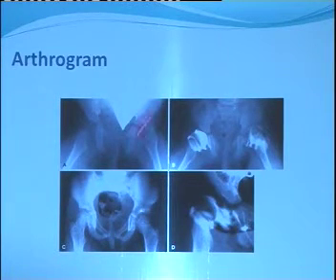On this side, this is normal, and here you can see there is a filling defect. The head is out of the acetabulum. Here one can see the hourglass-like appearance because the capsule is thin, compressed because of the iliopsoas tendon.